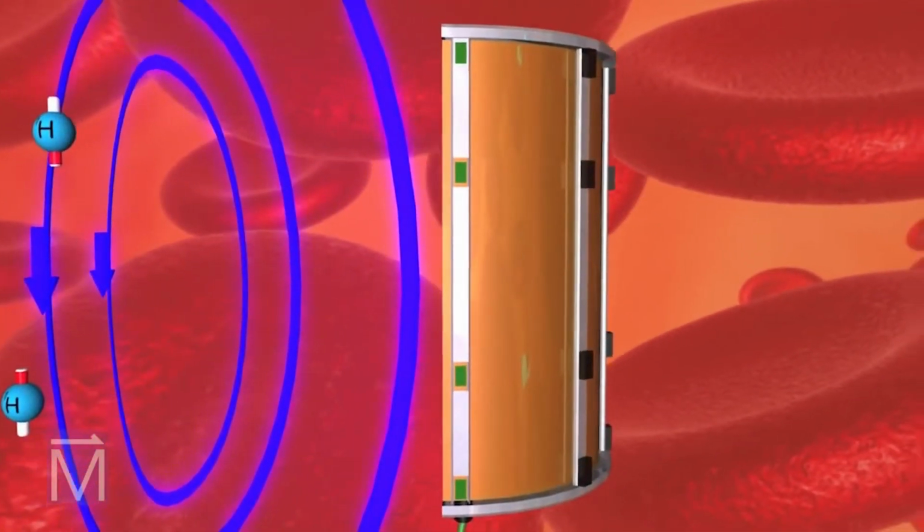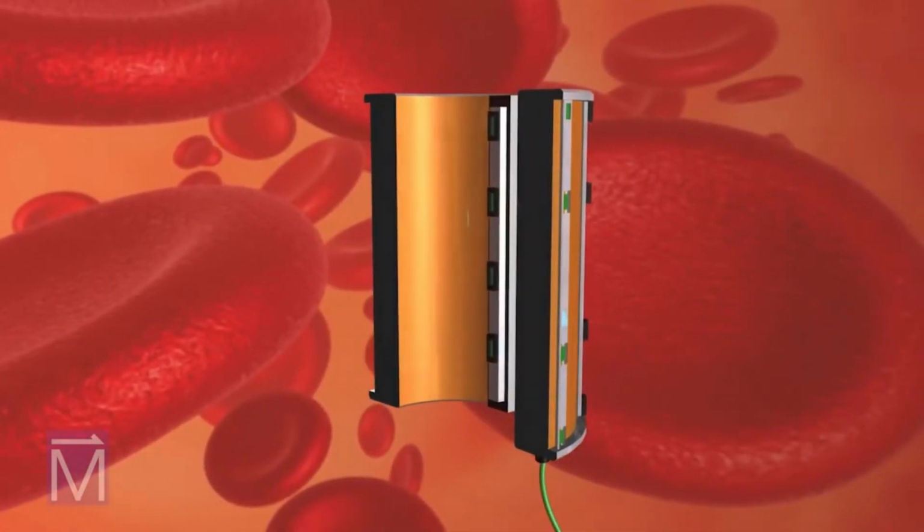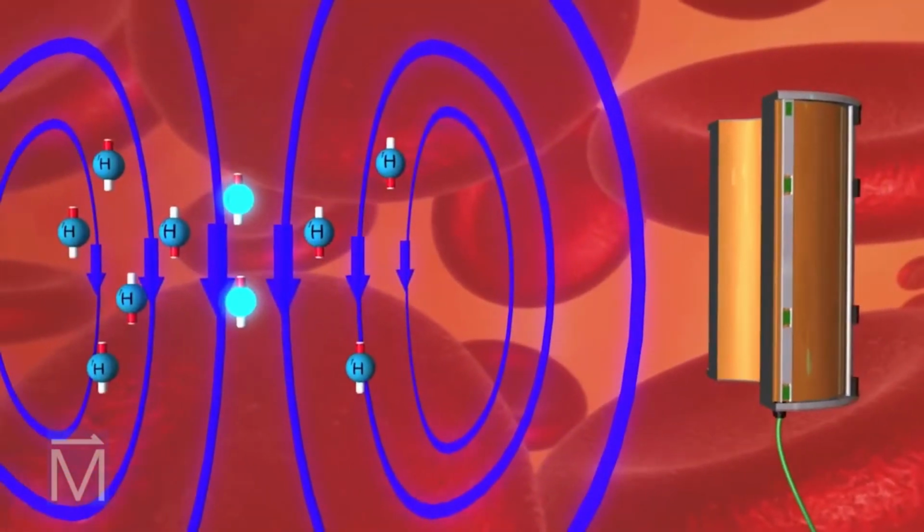Inside the MRI, an RF coil is placed near the part of the body being scanned. This is a radio antenna that transmits and receives radio frequency, or RF waves. The MRI technologist uses it to send RF pulses at the resonant frequency of the spinning protons.